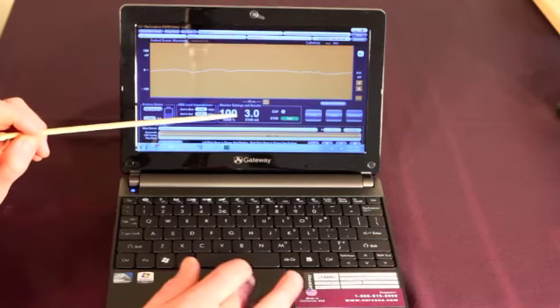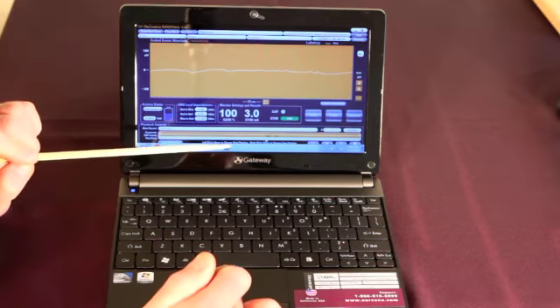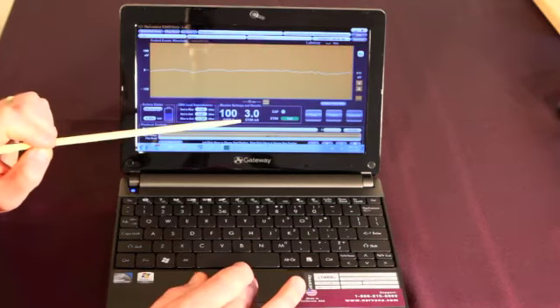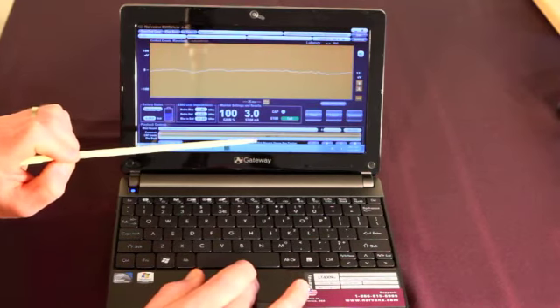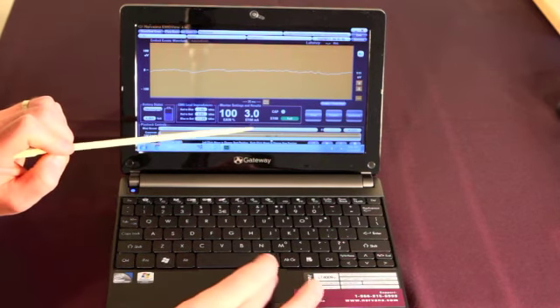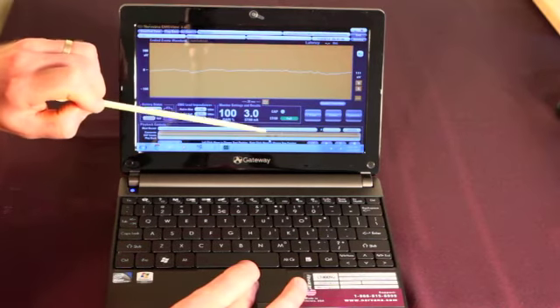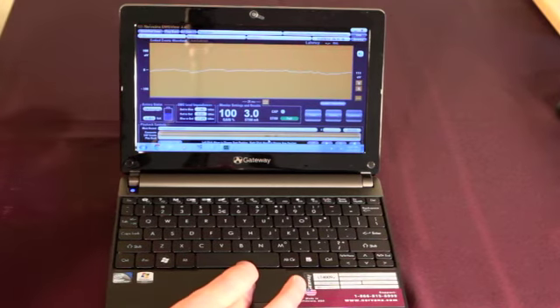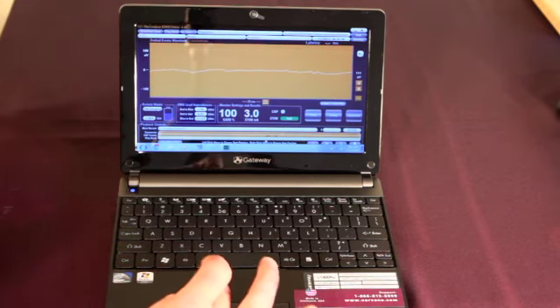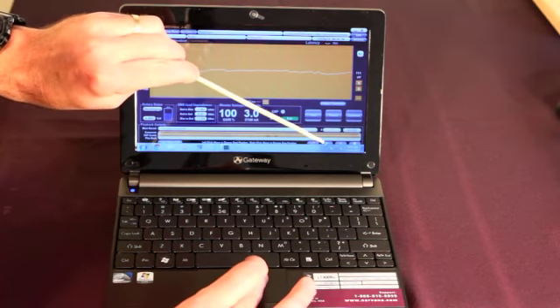I'm going to come over here, and in this bottom white playback bar, I'm going to left click, that's my typical mouse click, right there. Now what's happened is that green bar has shifted. Next thing I'm going to do is over here, I'm going to right click just beyond it and shift the red bar from the end over to here. Now I have a very small area which happens to coincide with many cap events that I'm going to review in more detail.